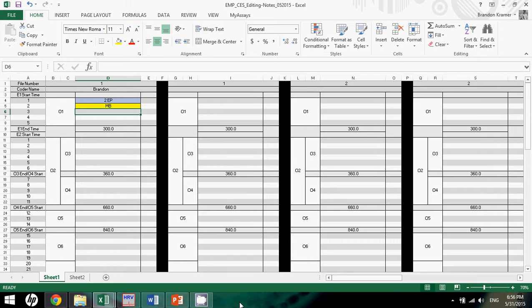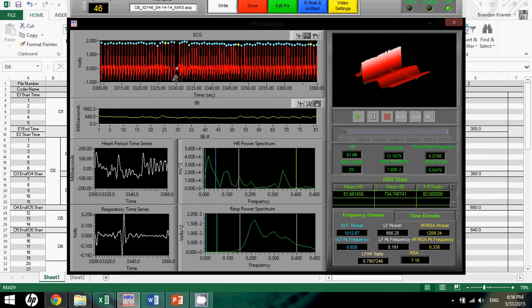Any more than 10% means that the segment will need to be deleted. Furthermore, you'll notice that a process where you have to mid-beat 2 in a row will not be tenable. It'll be impossible to do that because you essentially need markers on the outsides of where you're mid-beating. So in the case that you have to mid-beat 2 in a row, you won't be able to do that, and you'll have to consider that whole segment unusable.